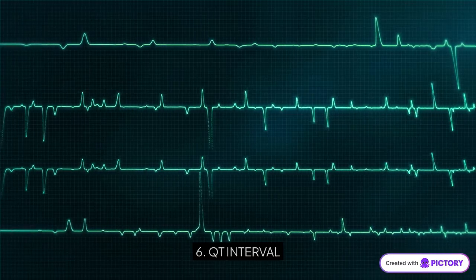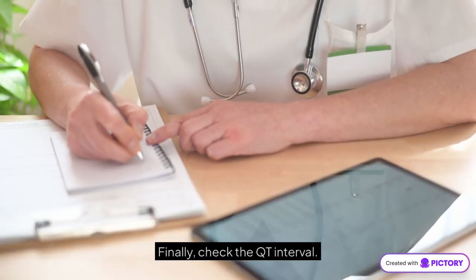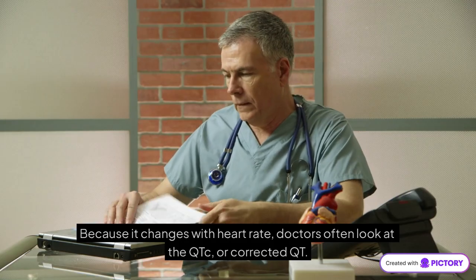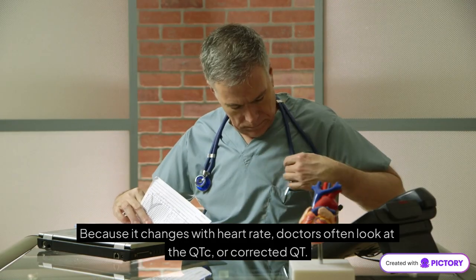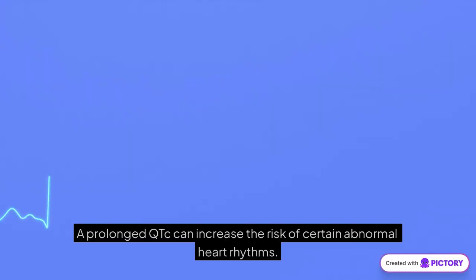6. QT interval. Finally, check the QT interval. Because it changes with heart rate, doctors often look at the QTc, or corrected QT. A prolonged QTc can increase the risk of certain abnormal heart rhythms.